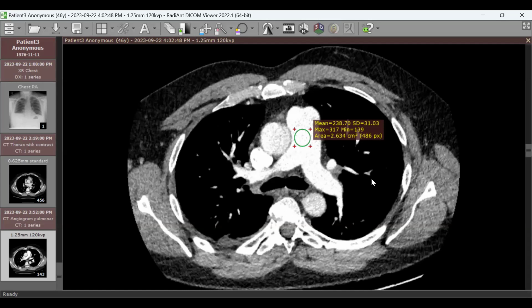And you know why? Because this affects the timing. You can't exclude emboli in the distal arteries like subsegmental, segmental, and probably lobar. This is one thing you need to check. It should be 250 and above.